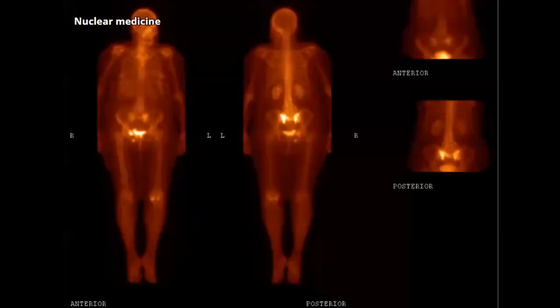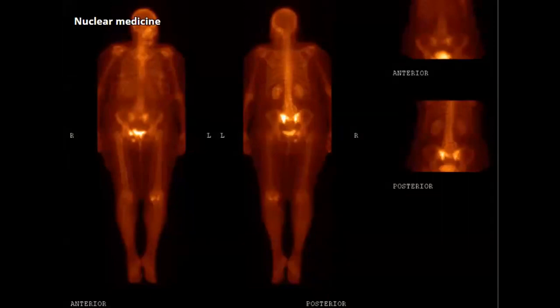Sometimes the bone scan can come to you in this image. In such a case, don't panic. Just take it easy. This patient has breast cancer. And the main finding here, just reverse the finding, the black and the white, in your mind.